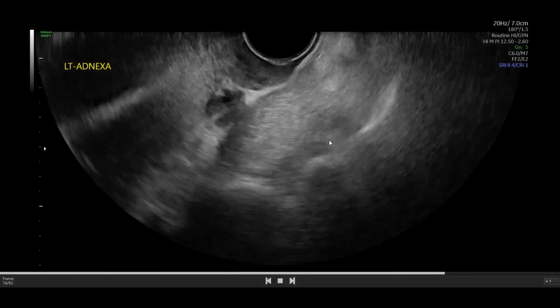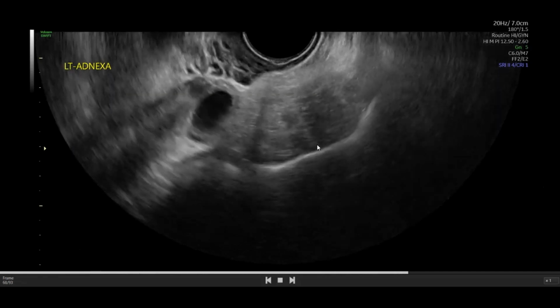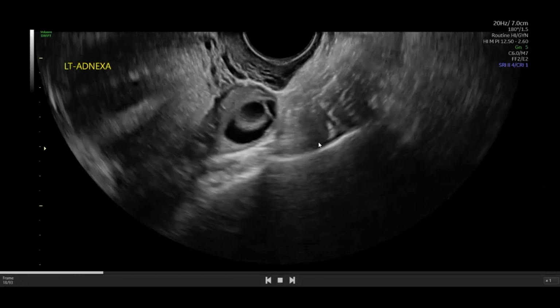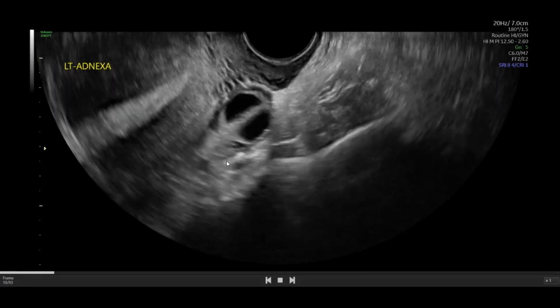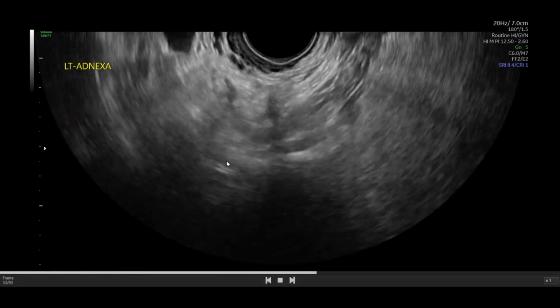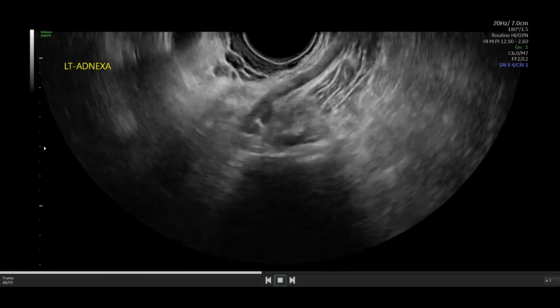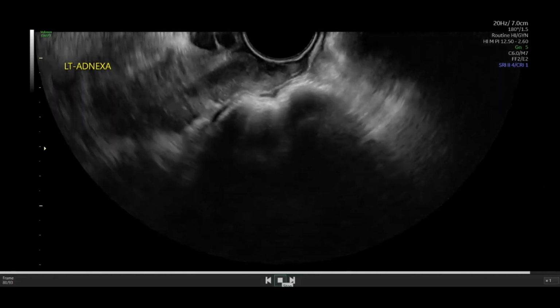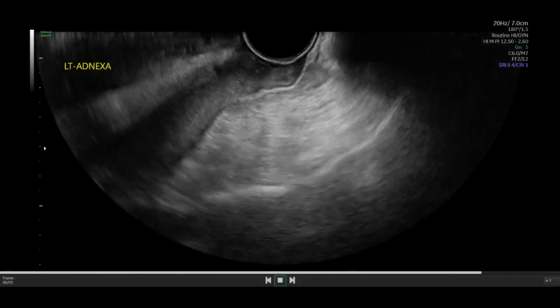Lots of cines, which is my preference. And I think it is really the way forward because sometimes, like we saw in the uterus, one thing is seen better in one cine versus the other. And sometimes the more you get, the more you're able to find, which is really our job, is to be a detective and identify things that patients have, which warrant assessment, which warrant treatments.